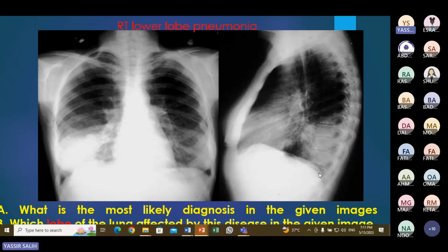will be confirmed on the lateral. If you remember, we told you the normal appearance of the spine on the lateral. Normally, it becomes darker as we go down. Yes, thank you, there is increased lucency, or darker. It gets darker when we go down. This is normal. But now there is a reverse spine sign, meaning the area above is darker and the opaque area is below. So this indicates there is a right lower lobe abnormality, because this area becomes opaque instead of black.